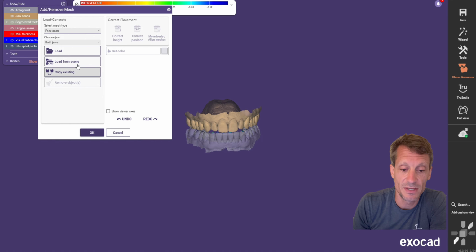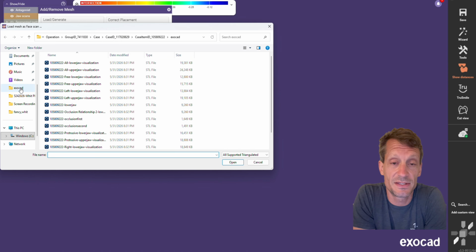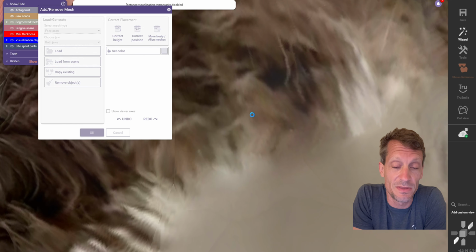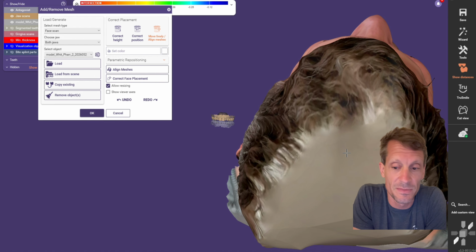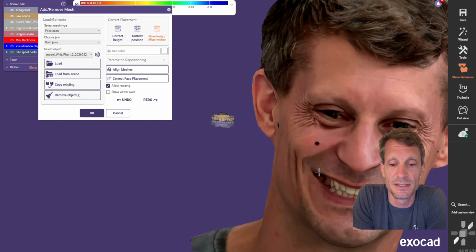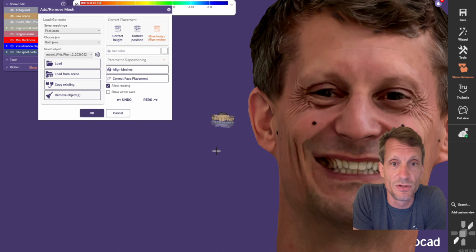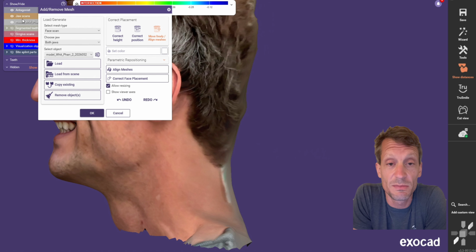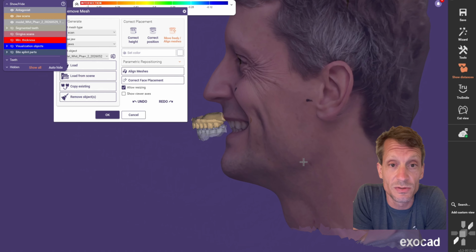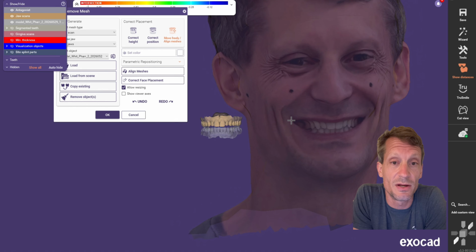I'm going to start this video here. And you can see I've loaded my scans in exocad, and now I'm going to bring in the face scan. Now, you did this with an iPad. I think you can also use your iPhone, anything iOS, the clone software works with. So first thing I'm doing is just getting things oriented to be very similar. If you're familiar with working in exocad, it's similar to when you're aligning two-dimensional photos to your three-dimensional scan, you're going to get things lined up to where they overlap.